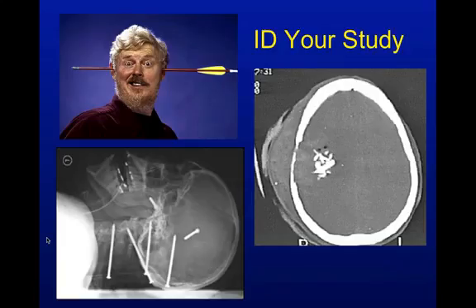But if the clinical picture doesn't fit the images that you're seeing, there's probably something wrong, and it's probably the wrong study. Okay? Arrow through the head versus nails. I hope that's a cadaveric experiment. That's pretty awful.